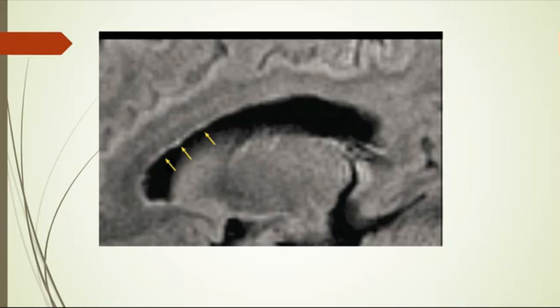So, what do we have here? It's a very characteristic pattern. What do they call it? It's very early onset of what? Multiple sclerosis. What's the appearance? No. They call it dot dash, dot dash, dot dash. This is what we call the dot dash appearance.